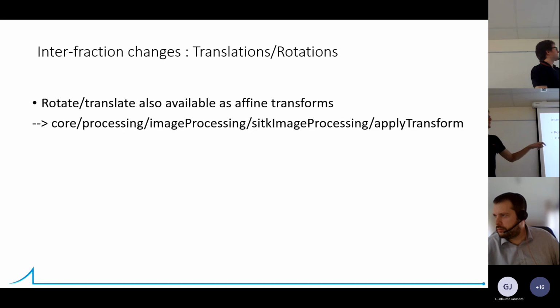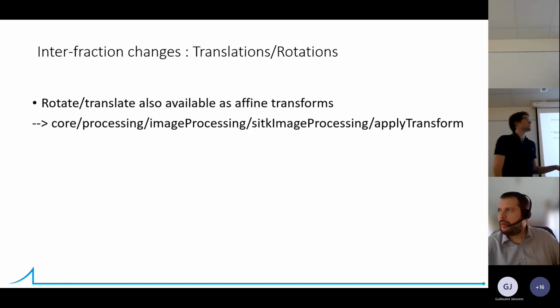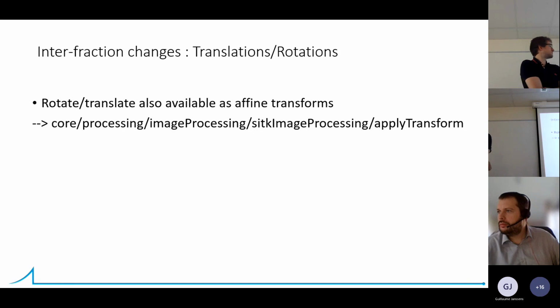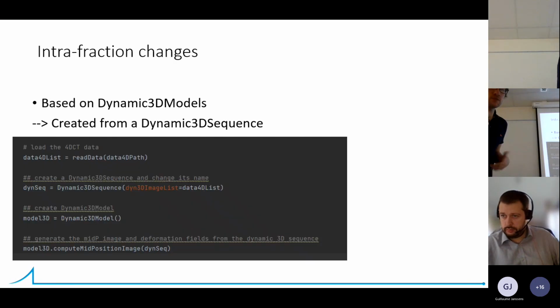There is also, in the core processing, image processing, SITK image processing, an apply transform that can apply an affine transform to an image. But it is not available for deformation fields, so that can be applied on images, but not on deformation fields. And in my team, we work on intrafraction changes also, because we want to create all these little variations that the patient could have during a treatment, including the different motions possible.